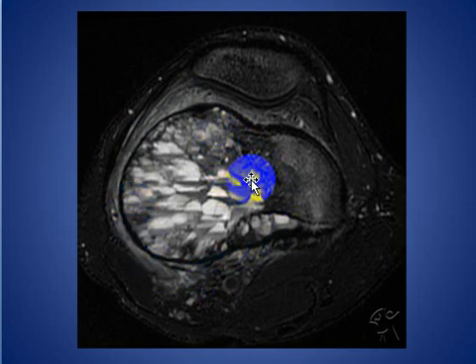And the differential diagnosis of multiple fluid levels in a bony region includes aneurysmal bone cyst and telangiectatic osteosarcoma. And as we said that the lesion is aggressive in the plain film, so the telangiectatic osteosarcoma is most likely the diagnosis.